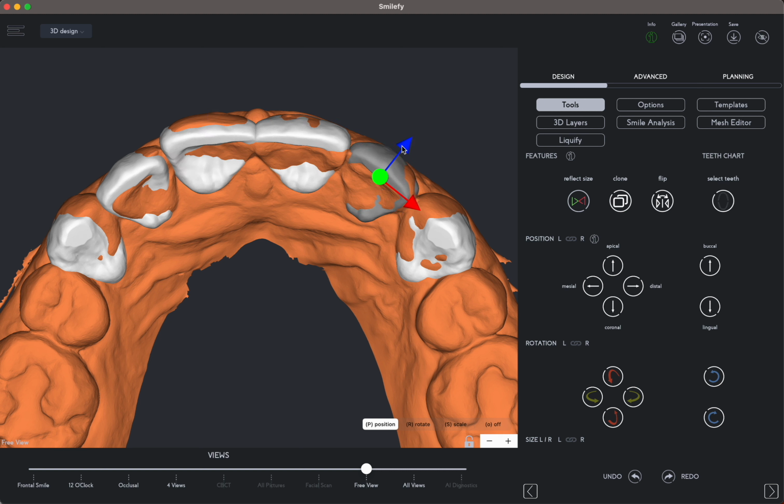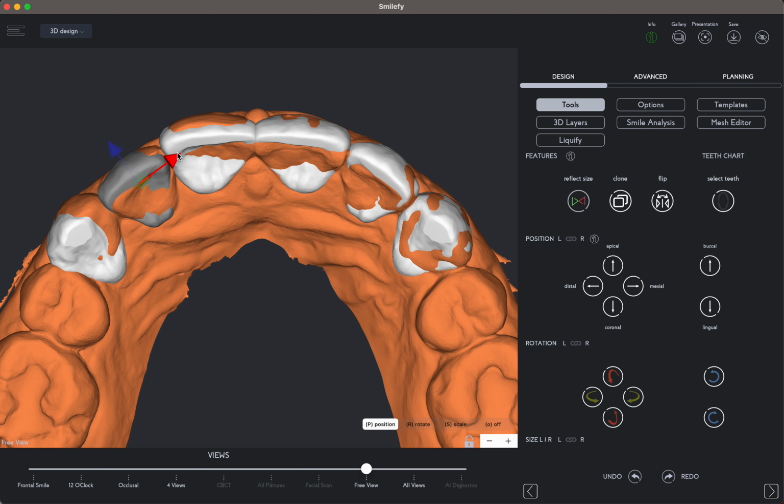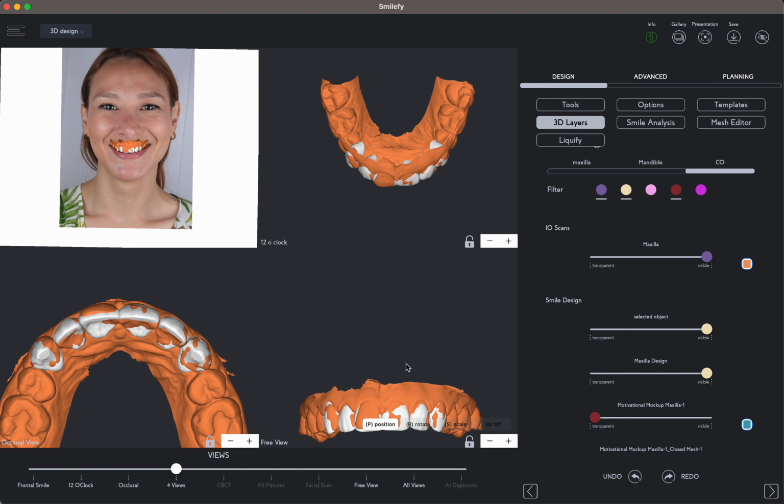When we design the ideal pre-op version, we also consider the patient's original teeth to preserve the lip support. When we design too far lingually, and we prep deeper, we lose lip support, which can have a negative impact on the overall result. In this case, we design buccally very close to the patient's original teeth.